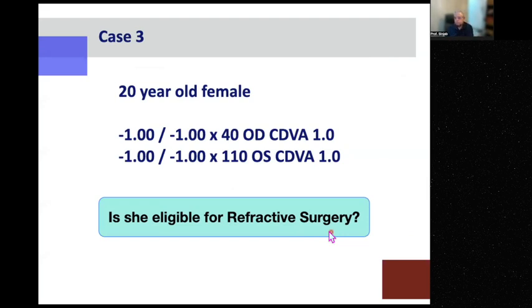Debatable. It is always advised to do surface, especially in our population. So depending on the age on this head, I would go with the surface. Oh, she is 20 years and female. Oblique astigmatism and against the rule astigmatism.